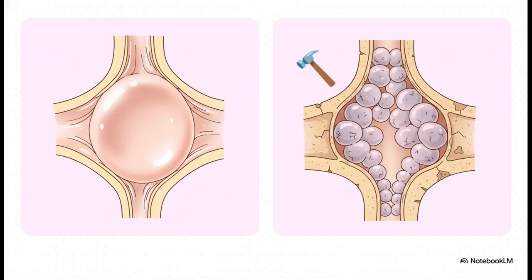Now, two really common benign things can fill up the sinuses and cause mass effect, but they do it in very different ways. A mucocele is basically a trapped, obstructed sinus that just slowly blows up like a balloon. The key word is expansion. It causes smooth, outward bowing of the bony walls. Sinus polyposis, on the other hand, causes bony remodeling and erosion. The classic giveaway is seeing the drainage pathways, the infundibula, get widened as the polyps literally push their way through. So remember, expansion versus remodeling.